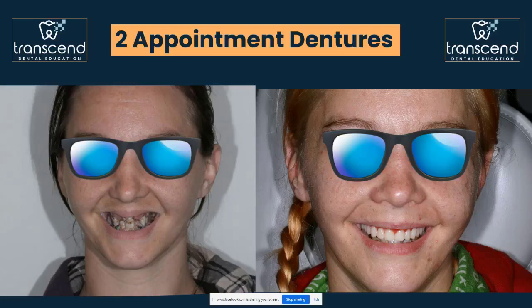All right, so this is what I'm going to be covering. This was a lady that we did some digital dentures on. We actually did a lot of stuff on her, but I'm going to show how I'd use it in, let's say, just digital dentures and utilize facial scans plus facial pictures with a simulation software so that we can really know exactly where to put those teeth and get great results, 99% of the time, your first try.